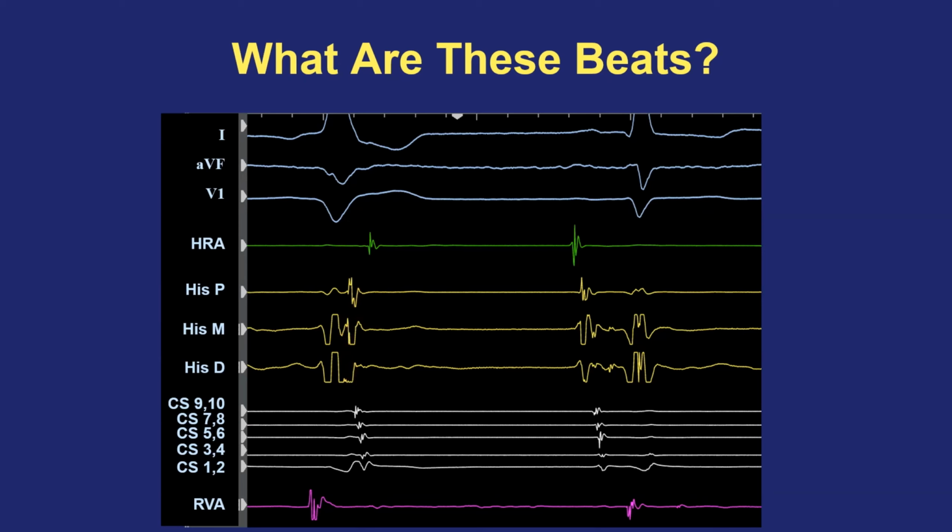The signal then simultaneously travels right to left out toward the left atrium, as you can see from the deflections in the CS catheter, but it's also simultaneously sending a wavefront across the right atrium back toward the high right atrial catheter near the sinus node in the superior vena cava. So these happen more or less simultaneously, but later than the septum is activated.